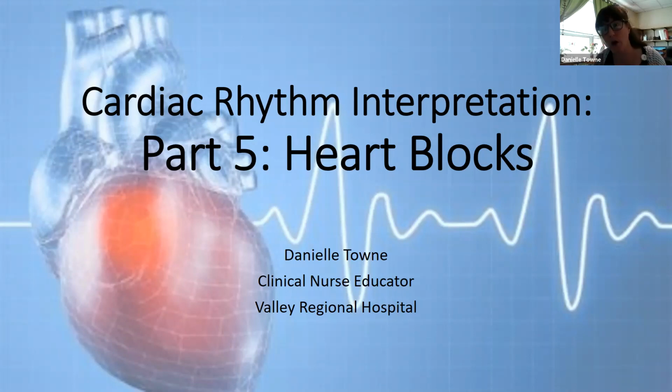Heart blocks, I think, are one of the hardest things for people to understand. I really struggled with them early in my career, and I did several different EKG classes and always had a hard time understanding the differences, and we get them confused. I'm hoping that this will be helpful. There's a really fun way to remember heart blocks that I'm going to share with you at the end of this. But it is a challenging aspect of EKG rhythm interpretation. So if it takes you a while to master this piece, that's very common for a lot of people.